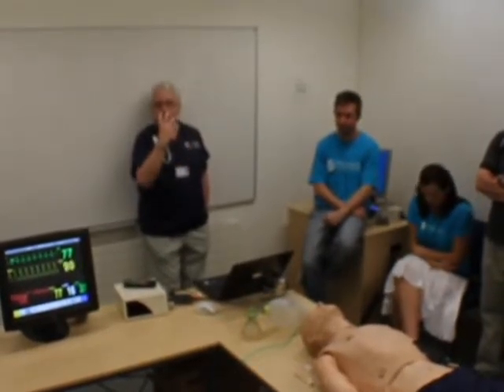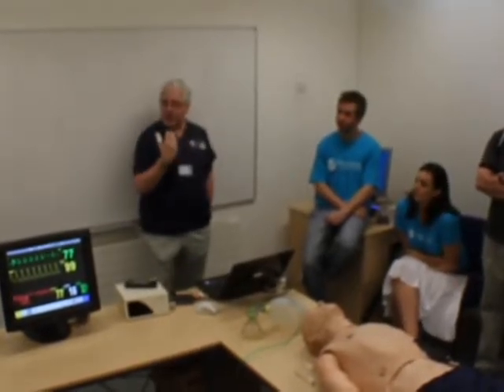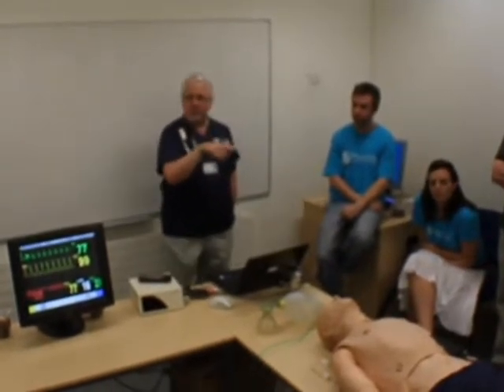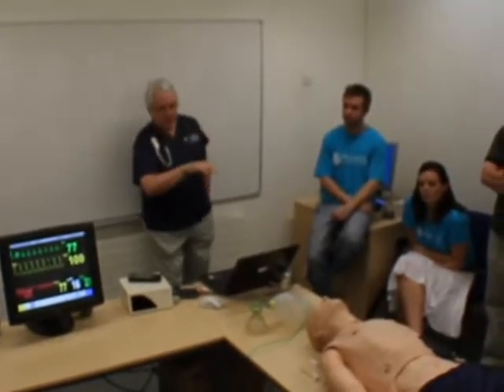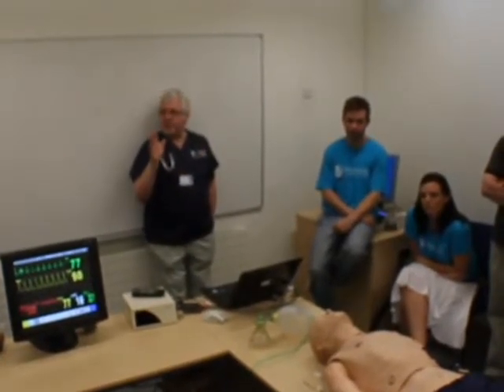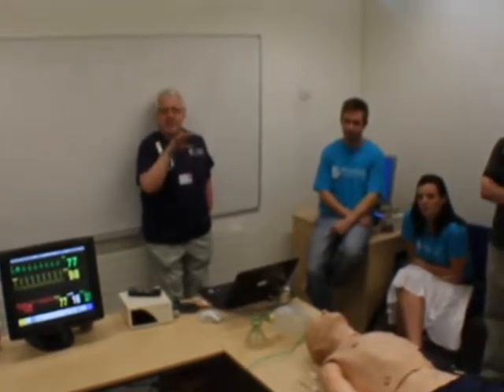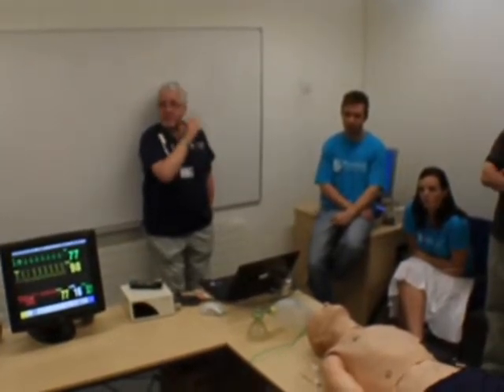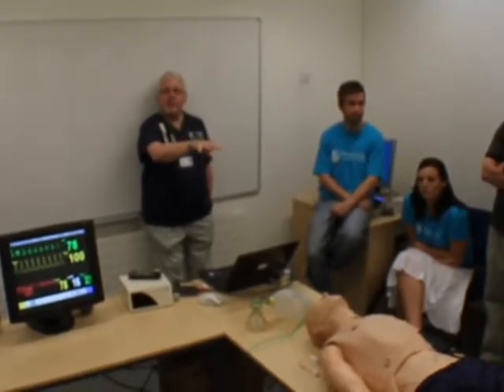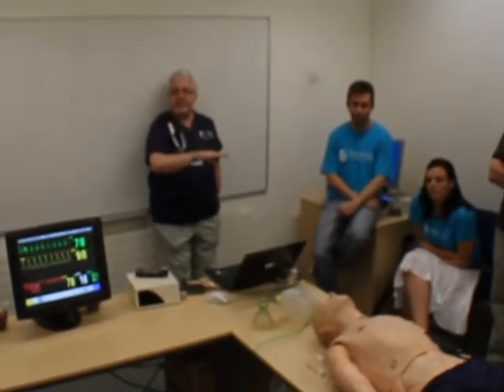His tongue can swell up to block his airways, as though he had a peanut allergy and had an allergic reaction. And we can control all of these different effects using the computer screen to give him a whole range of different conditions or illnesses. And then what we do with our 5th year students is we get them together as a team, we make our simulator here really ill, and then we say, in you go into this room and get him better.